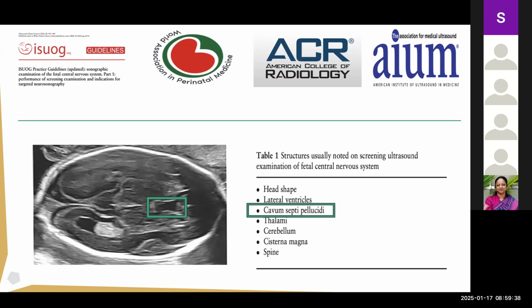In both conditions the CSP is formed, and then there are perforations in the septum, which we know can happen after it is formed. So if the rest of the brain is clean, I tend to reassure in both these perforation issues and in filled-in or echogenic CSP. Septated CSP, though, madam, we can leave it. It is not even worth mentioning.